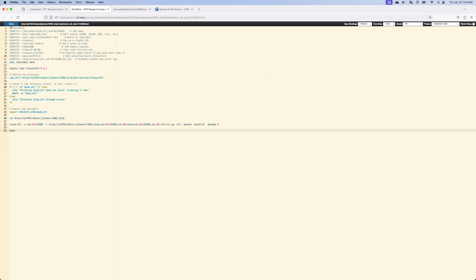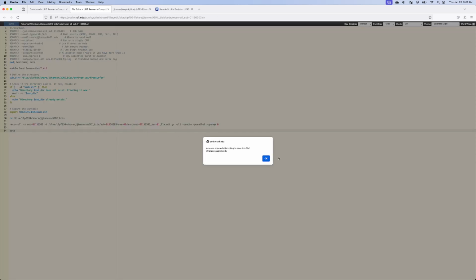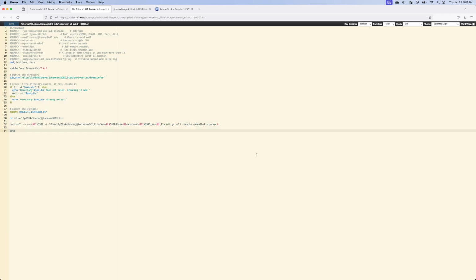Okay, so save that. An error occurred. That's great. Not really great. So I'm going to copy all of this. I'm going to try saving again. Maybe it saved, but just to be safe, we'll copy all of that. I'm going to close this because I have this copied. So this is where doing it offline in Visual Studio Code is safer, and really what I would recommend.